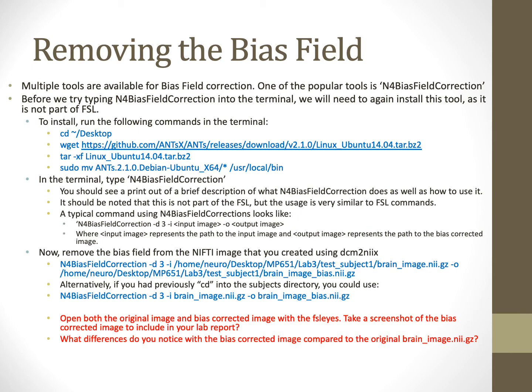Open both the original image and bias field corrected image with FSLeyes. Take a screenshot of these images to include in the lab report. What differences do you notice with the bias corrected image compared to the original brain image?